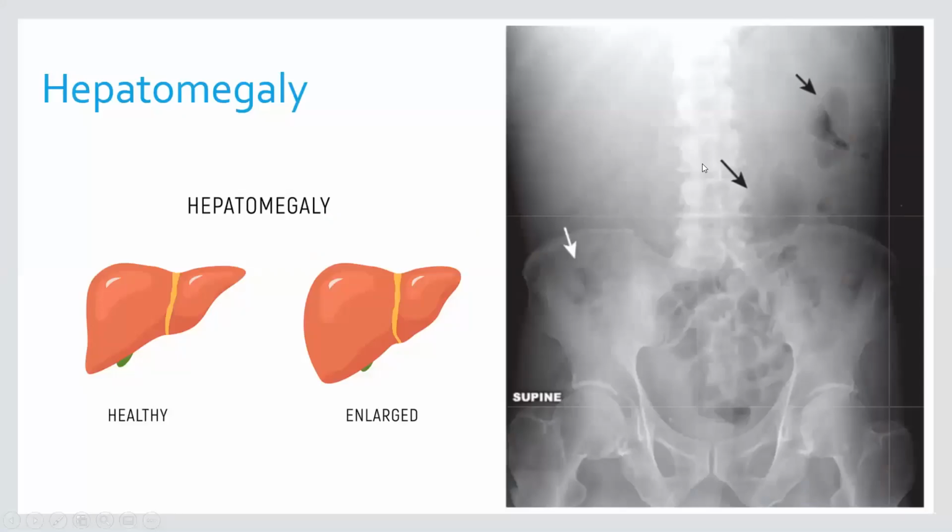Okay, so let's go to the other section, which is organomegaly. Organomegaly means the occupation of space by this increased in volume or increased in size organ. How does it appear when I assess for any organomegaly on the abdominal X-ray? I either look at the displacement, or I look at the shadow of the organ getting increased, and if I have things of different shades, I will have the edge appearing, or I will look at the displacement of the gas pattern, which is the large bowel.